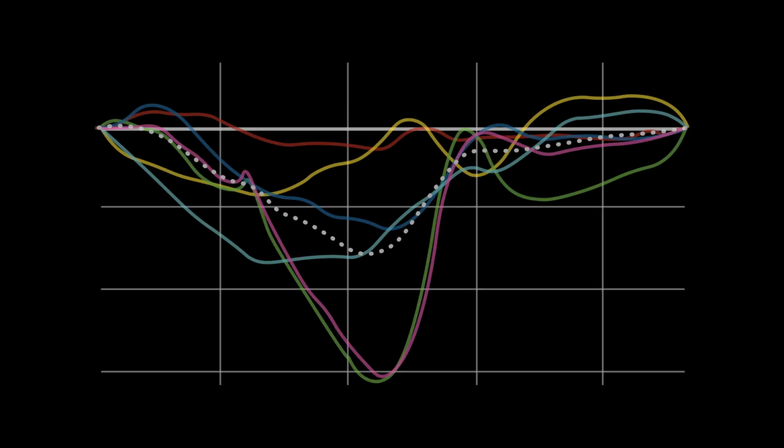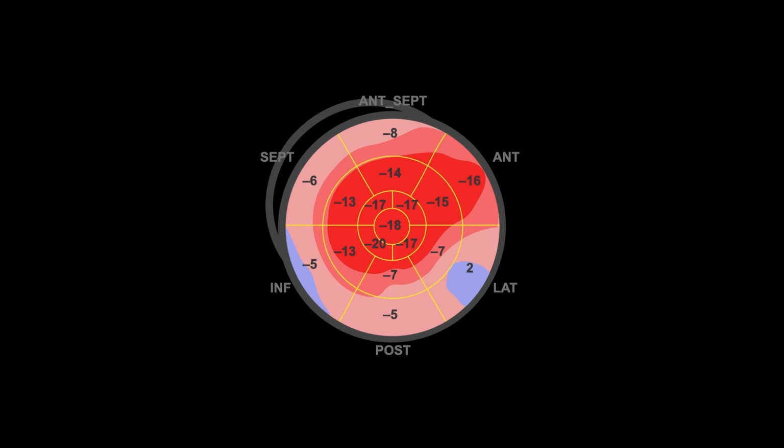In the case of myocardial infarction or left ventricle dysfunction, the strain graphs are not in sync with or slope downward together with the AVC. And the wall segments don't move in the same way, indicated by the disorganized lines. On the bullseye plot, any akinetic or aneurysmal basal walls, indicated by blue, suggest myocardial dysfunction and regional specific patterns of ischemia or infarction. This can be determined by looking at the GLS value, which will be less negative.